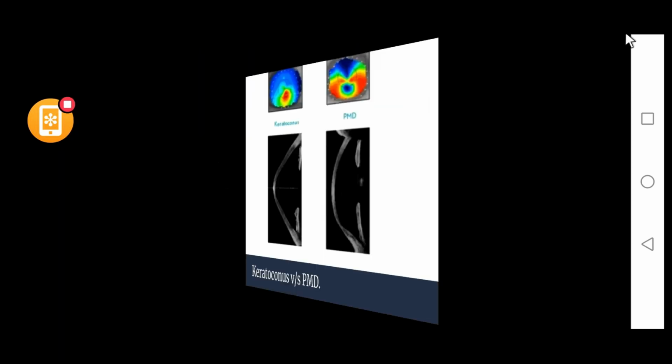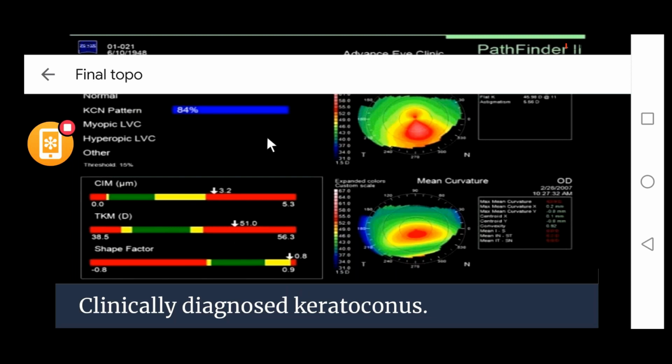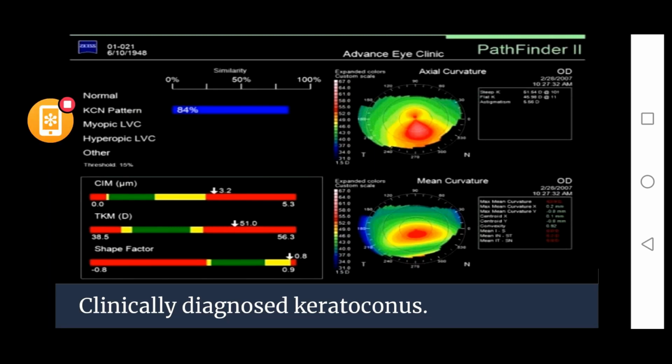Now this is again a case of clinically diagnosed keratoconus. Can someone please come ahead and try to read this report, if anyone would like to? Anyone? All right, so let me just do it by myself.